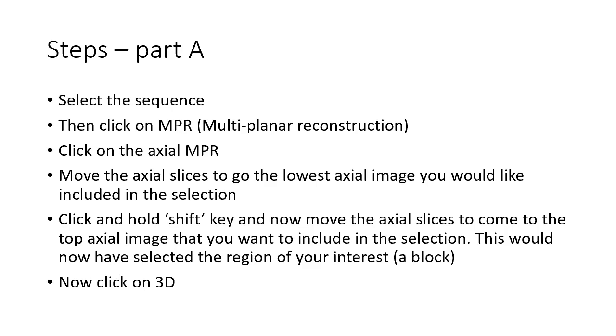I'll take you through the steps that I did to create this 3D rendering. What I wanted to know was where is the ear and where are the ventricles. So first of all, I chose a MRI sequence, then clicked on MPR, which stands for multiplanar reconstruction. That gives you the axial, sagittal and coronal views.